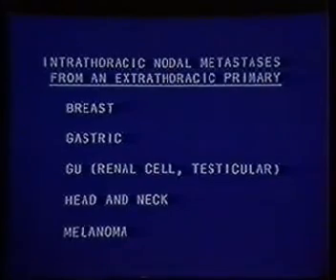So these, I think, are important to keep in mind if you have a young patient presenting, as this one did, a patient not in a good age group for bronchogenic carcinoma, who had a large right paratracheal mass, also a pretty good sized left supraclavicular nodal mass. This turned out to be metastatic embryonal cell carcinoma.